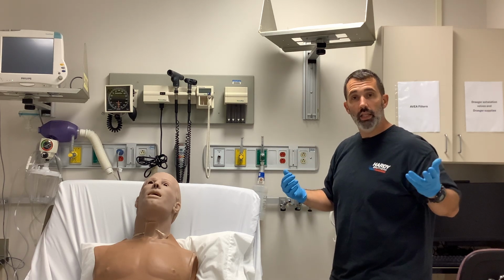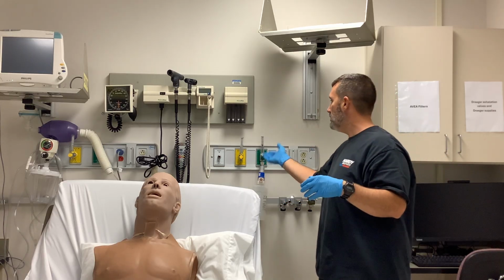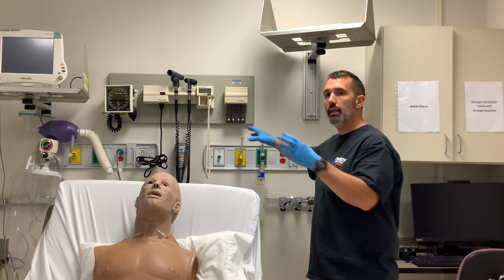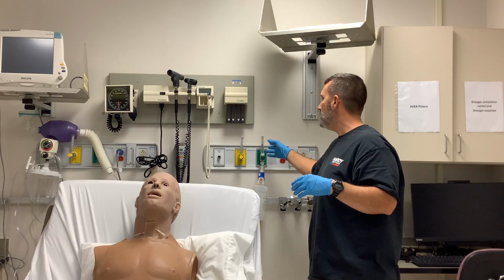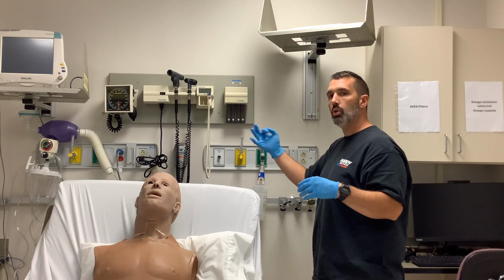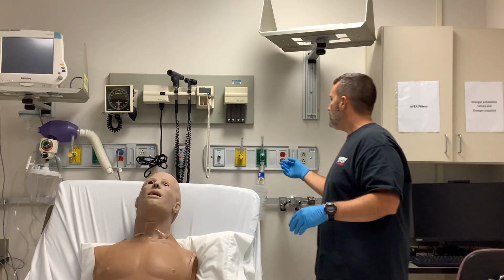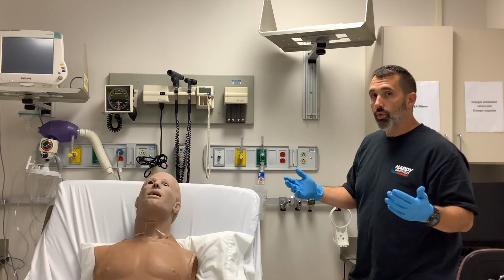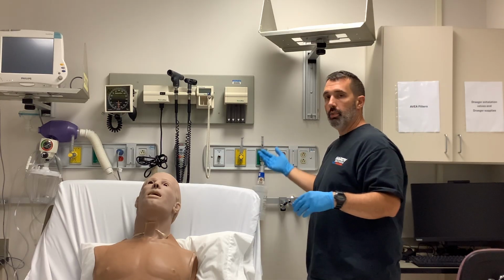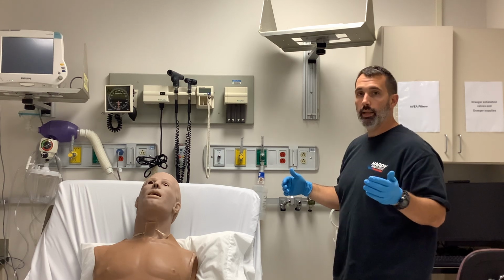That's right, 15, because 3 times 5 is 15. It has to take in 3 times as much air as it does oxygen. So for every liter of oxygen, it's got to pull in 3 liters of air to give you that 40%. However, the total flow through the system at this point is 5 liters plus the 15, which is 20 liters.